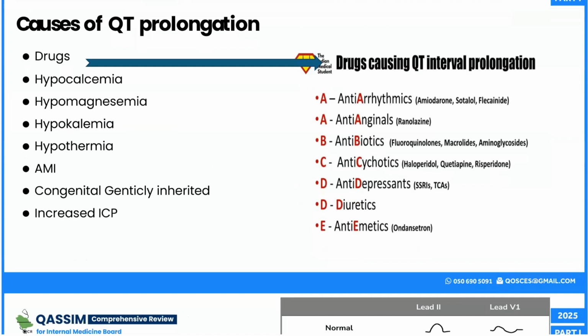The P wave is your sneak peek into your atrial assessment. It is usually upright in the inferior leads because it is heading toward them. And a P wave can help with atrial enlargement. A right atrial enlargement will have a peaked P wave in lead 2. The most important two leads in the assessment of atrial enlargement are lead 2 and lead V1.